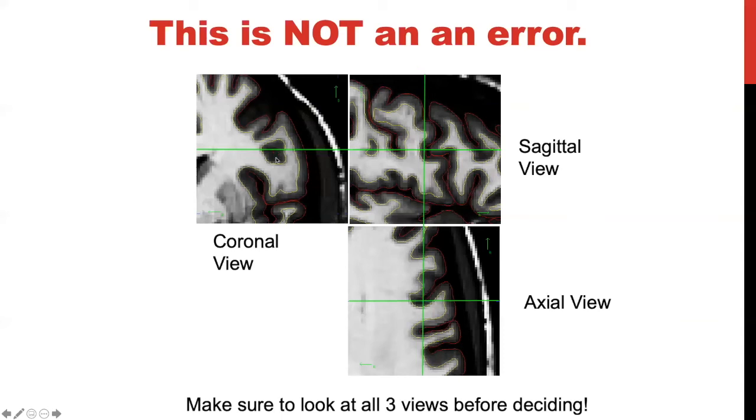This misclassification of the gray matter looks a bit abnormal, but if you actually look at it in your sagittal and axial views, it's just a sulcus that is being represented. A good recommendation when you use FreeSurfer is to always think of your brain as a 3D volume. But of course, when analyzing in 2D, just remember to reference that back.